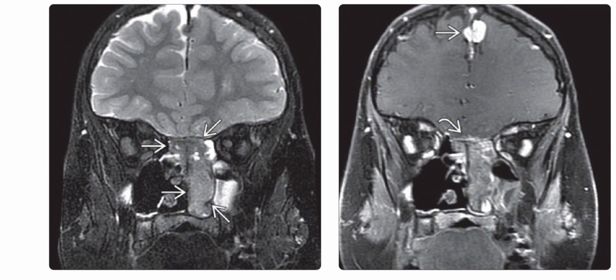Right is the coronal T1 weighted contrast-enhanced fat-suppressed MRI sequence, and it shows the moderate enhancement of the nasal mass, which infiltrates the dura above the roof of the ethmoid air cells. A falx meningioma is also noted.